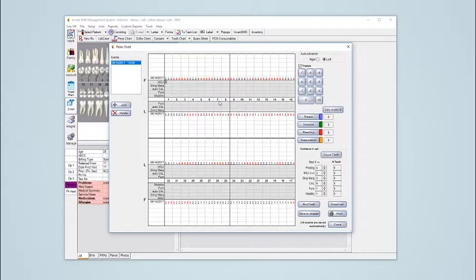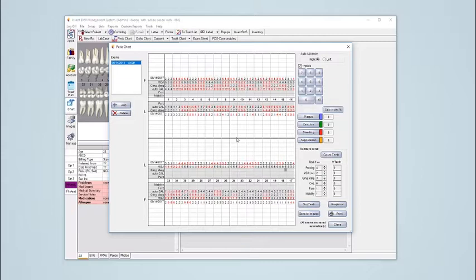I'm going to go ahead and start adding the readings while keeping the same triplet number just like that. Yeah, so these are random numbers just for illustration. There we go. I'm going to go and add the gingival margin. Now here we need to pay a bit of attention. As I'm adding the gingival margin readings, I'm just gonna go ahead and finish it off.